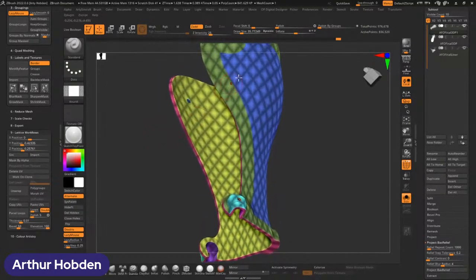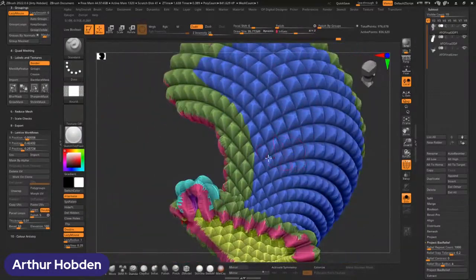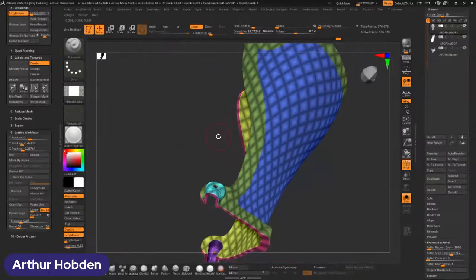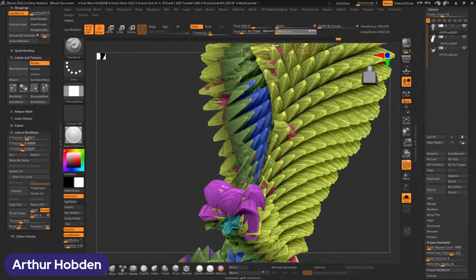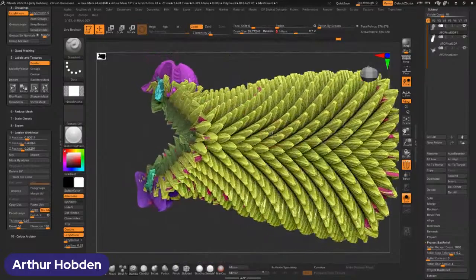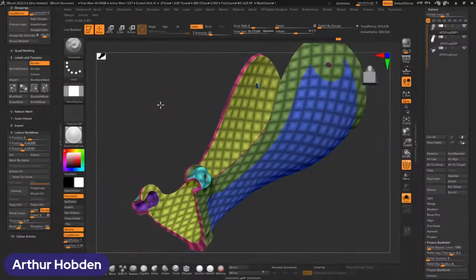Now, I don't want to do anything with this like this, because if I start exploding this, we're going to get some nasty results on the inside and outside, which we don't want, right? Look how crazy that is, eh? Just how instantaneous ZBrush can make destroyed geometry and not crash. There's no other program that can do this, guys. There really isn't. So we can Control-Z, remove that.